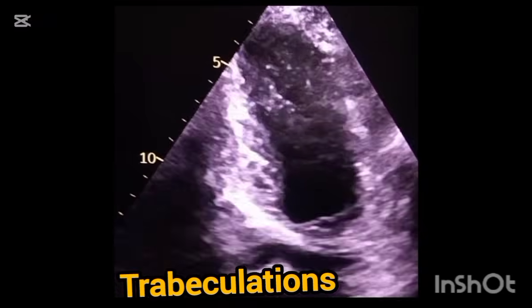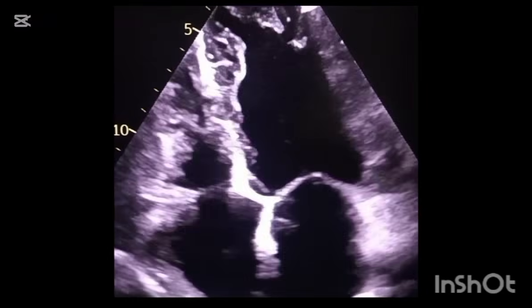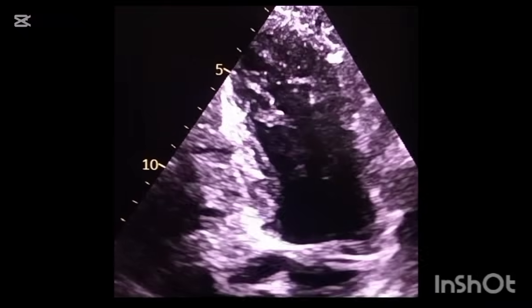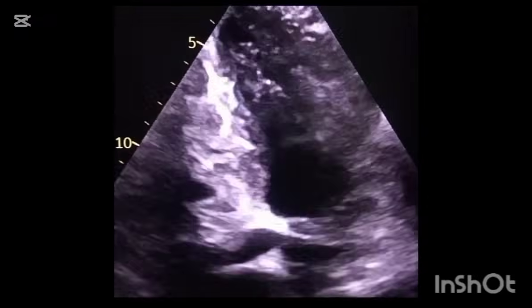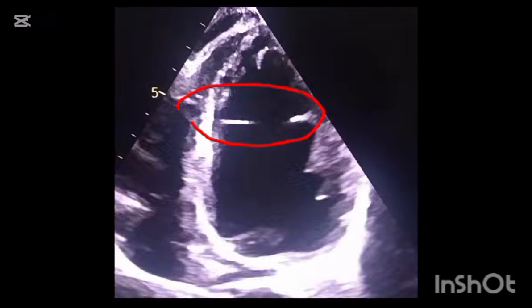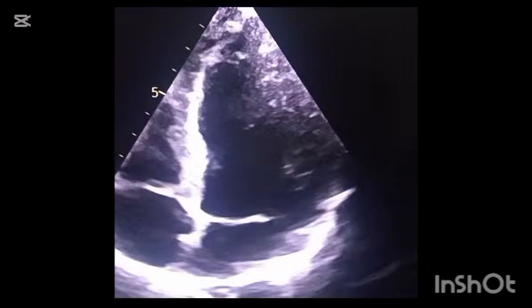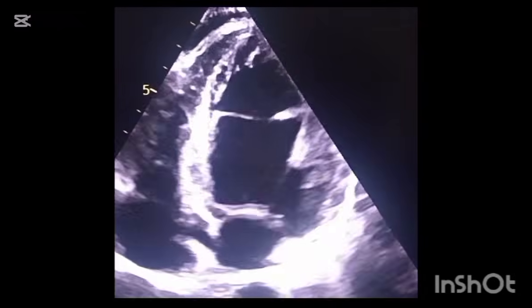Here the patient has atrial fibrillation and the LV apex looks like it is filled with layered thrombus. But these are trabeculations, which are a normal variant and sometimes misinterpreted as thrombus. Look at the bridge between the septum and the lateral wall. This is a false tendon or false cord.